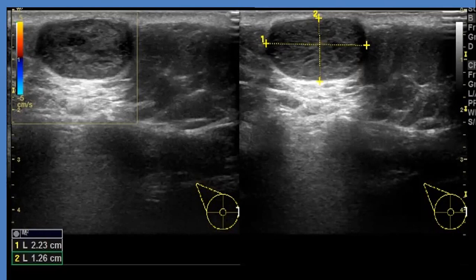Hypodermis. Okay? So where exactly is that lesion located? In the dermis. The bulk of this lesion is located where?